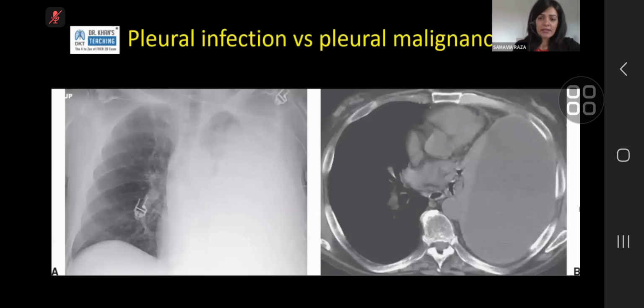This is a slide showing you almost a complete whiteout of the left chest, a bit of the left upper lobe left over there. So unilateral large pleural effusion, but you can see that they have monitoring on, and the patient is unwell, judging by the wires and the leads you see on the film. So unilateral pleural effusion in a cancer patient, the patients are usually extremely well, and they almost always present at outpatient. They may get a bit breathless when they lie down flat, or they have had loss of weight that is a bit unexplained.